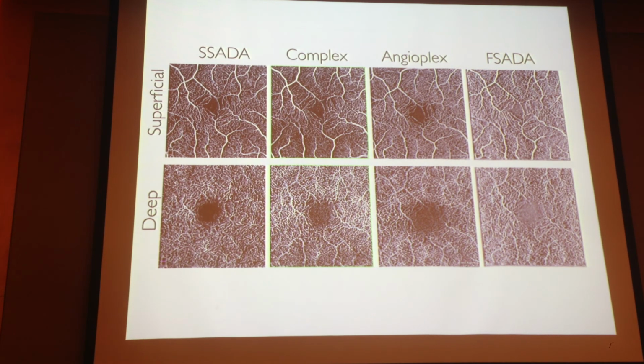So the difficulty for diabetic macular edema or any macular edema is that the layers can change before and after treatment. So you probably cannot image exactly the same layer. But for the penetration of the light, there is no problem with edema. You have a problem with hard exudates, anything that masks a normal OCT reflective image.